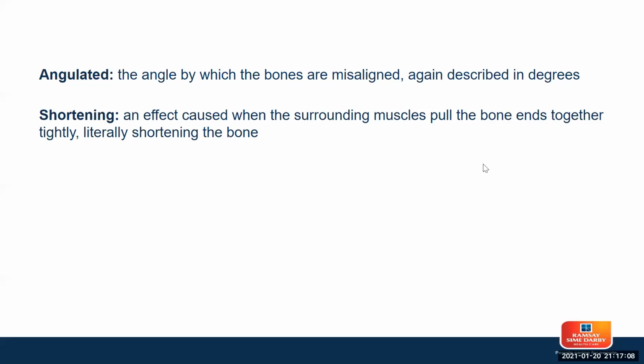Just to note, if you have a long bone fracture, like a radius and ulnar fracture in an adult, you will notice that the bones are not always intact. They tend to be displaced. That usually happens because of the muscle pull due to the bone attachment of the muscle to the bone. Once the fracture occurs, the fragments are pulled apart by the muscle. So if you have no muscles, generally it will be straight.